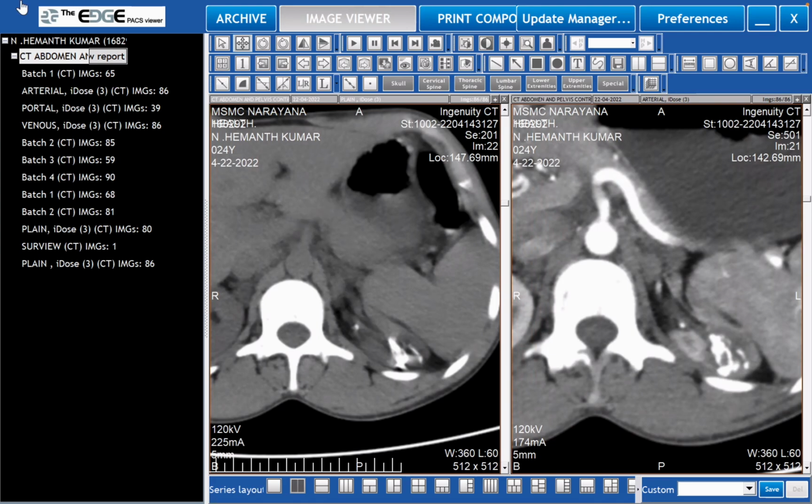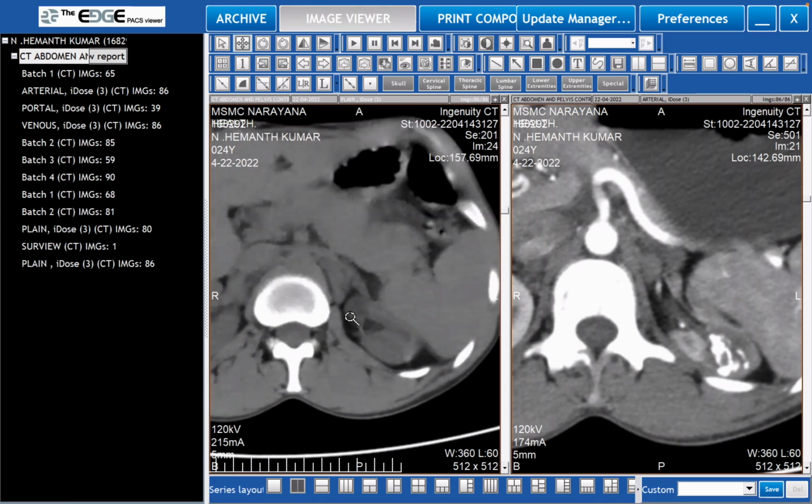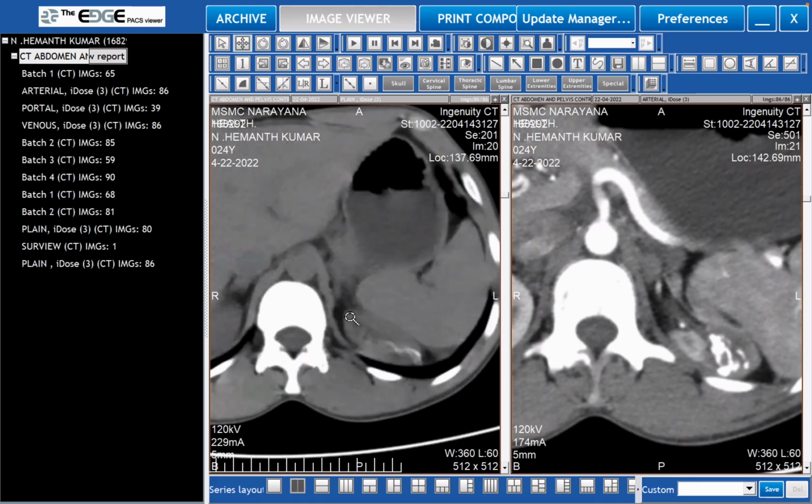So you look at the opposite kidney also. Look at the opposite kidney, which is a functioning good kidney. Yes, it's in the corticomedullary phase of that and see in this, what is that? That is still not yet showing you the PCS. It's still in that early phase.